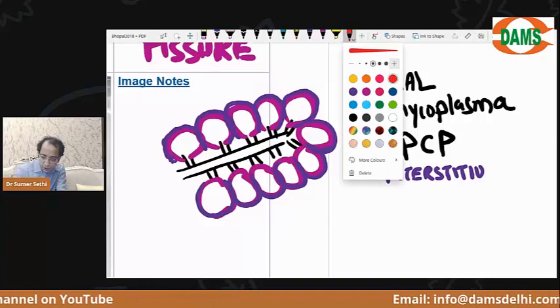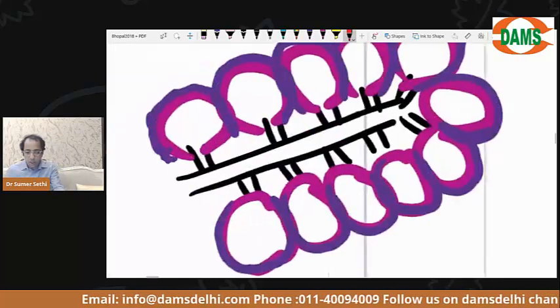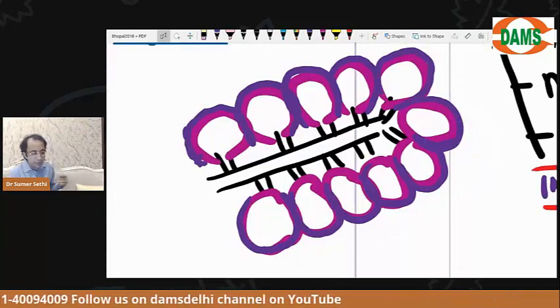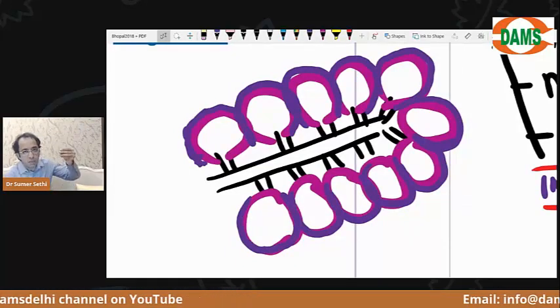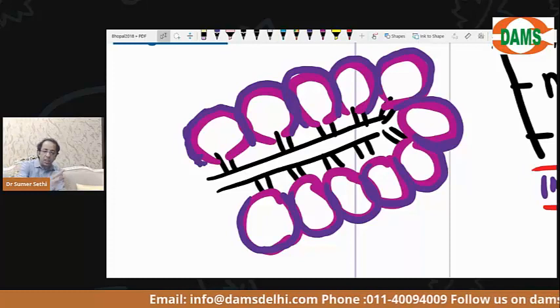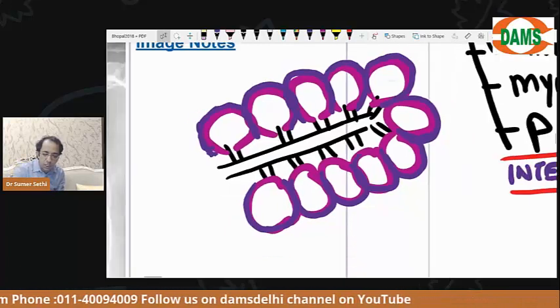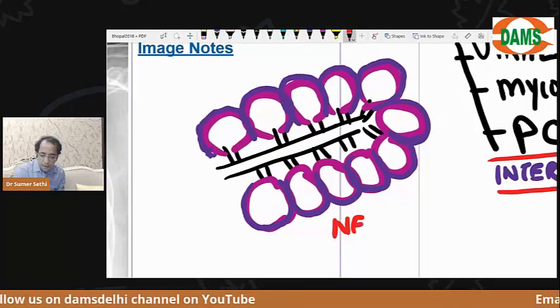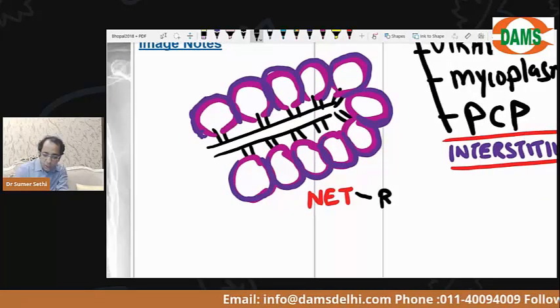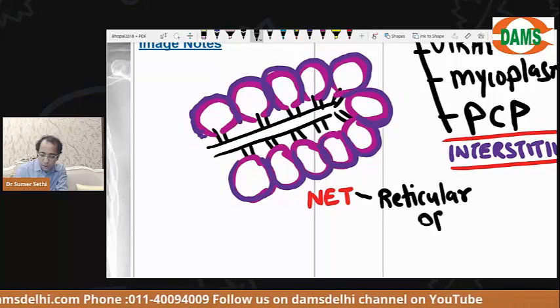Okay, everybody understands? Now I want you to focus, beta. Look at this. Now imagine this on the X-ray. What will happen? In the X-ray, the interstitium will have edema, so it will be thickened. The thickened interstitium will be seen on X-ray, and there will be air in the alveolar spaces. It will look like a net. In Greek and Latin, the net is called reticulum. So we will use the term reticular opacities.